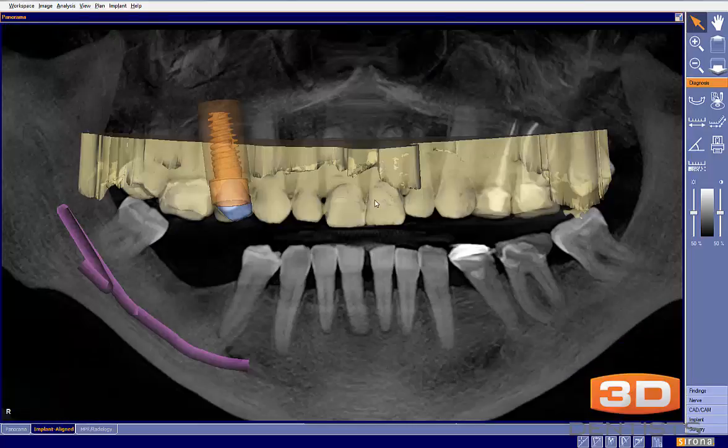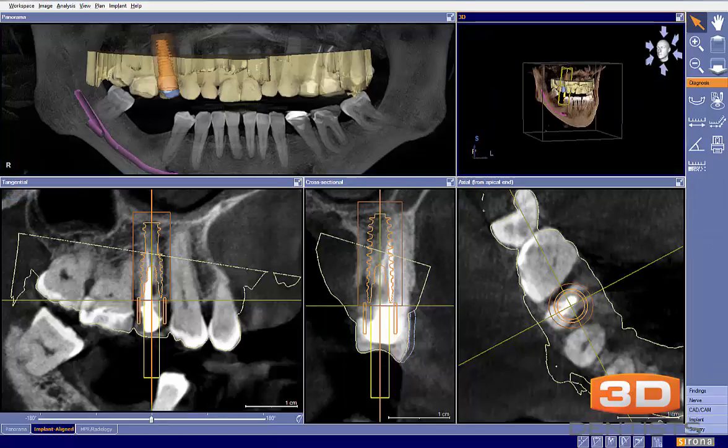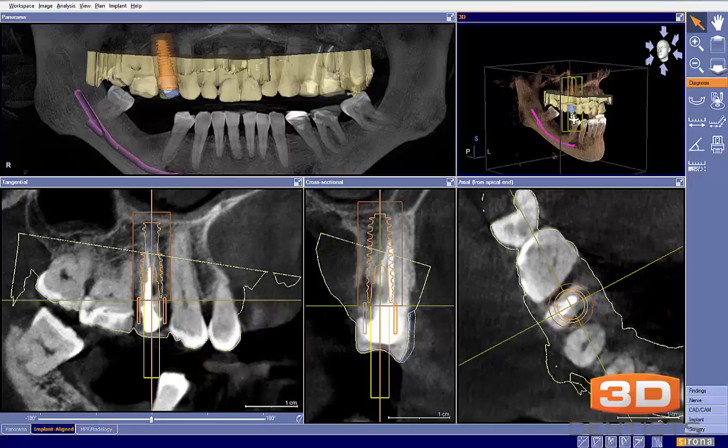So first thing I always ask, again, digital or analog workflow. Digital workflow. This gives us the option of OptiGuide, digital DigiGuide, and CEREC guide. In this particular case, I would certainly say CEREC guide would be perfect. We've got plenty of data here. Got a single tooth site, perfect for CEREC guide. Looks like the question here is going to be whether or not to evaluate the plan. Can an immediate be done here, and how does the plan look in relationship to that?